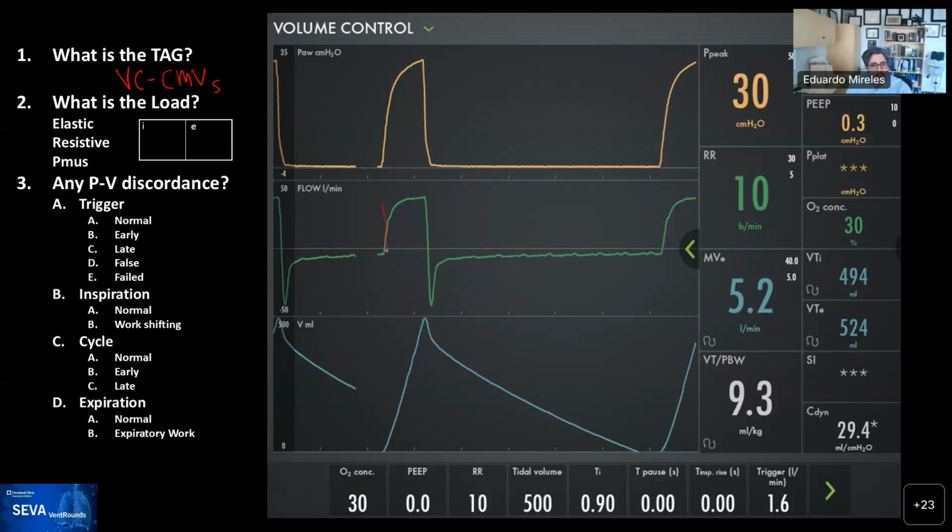And a reason for that, just to clarify, some of the ventilators may not display what you expect to see. In this case, whenever we see this little symbol, what we know from the engineers for this ventilator is that this essentially creates a simulated waveform based on what they assume the trachea would be seeing.